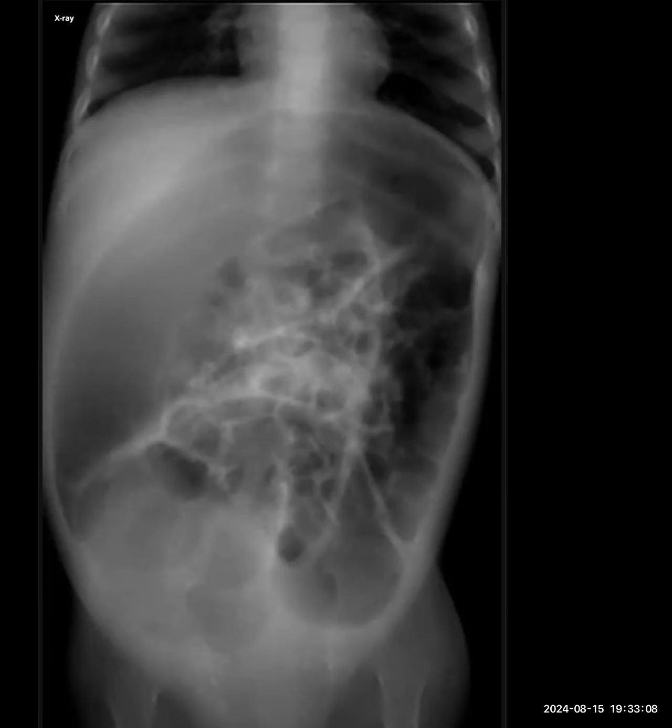What else can it be? Then it could be meconium ileus or ileal atresia also. No, sorry, ileal atresia will have microcolon. And meconium ileus? Meconium ileus also presents with microcolon. So this is a large bowel dilatation, and I think the most likely diagnosis is Hirschsprung's disease, or an anorectal malformation is a possibility. I would like to do a fluoroscopic lower gastrointestinal study for this case to further evaluate.